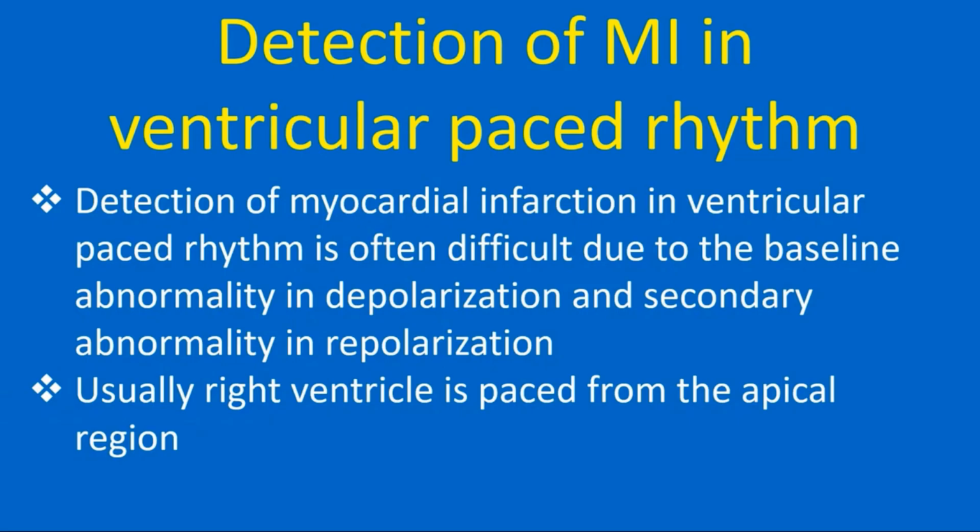Detection of myocardial infarction in ventricular pace rhythm is often difficult due to the baseline abnormality in depolarization and secondary abnormality in repolarization.